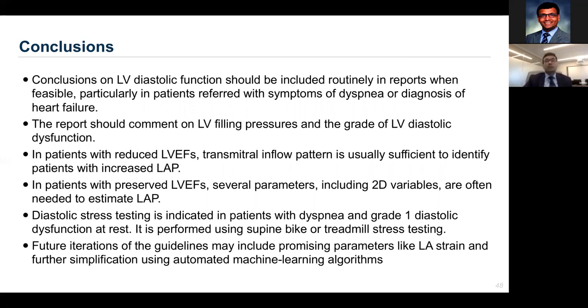In patients with reduced LV ejection fraction, the transmitral inflow pattern is a very good index for grading diastolic dysfunction. And using a multiparametric approach, we can arrive at a fairly accurate assessment of left atrial filling pressure, particularly in patients who have myocardial disease or abnormal LV function.